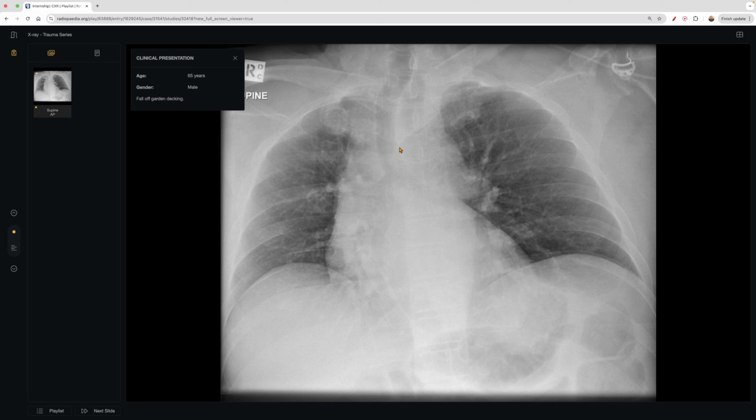But you also can appreciate how the heart is actually moved more towards the right, or at least looks more towards the right. And you can see how knowing normal versus abnormal, you'd say, okay, well, this patient otherwise has a normal heart, but they're more skewed to the right. So that's important to consider in your quality. And while this person is somewhat mal-rotated, you can see here also there's 1, 2, 3, 4, 5, 6, 7, 7 ribs here. And so everything's gonna look more crowded, right? It looks a little bit more pathologic, even though this case was read as normal.